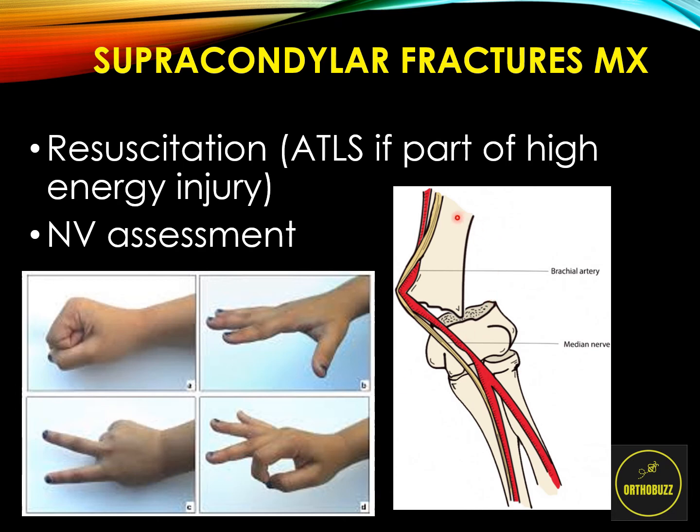And this is why. With supracondylar fractures, we have the brachial artery and the median nerve, which run anteriorly. Therefore, one of the fractured ends can tent this or put pressure on both of these structures. With the median nerve, this will most likely affect the anterior interosseous branch, which will compromise the function and the ability to make an OK sign. And any vascular compromise is certainly urgent, if not emergent, to deal with.